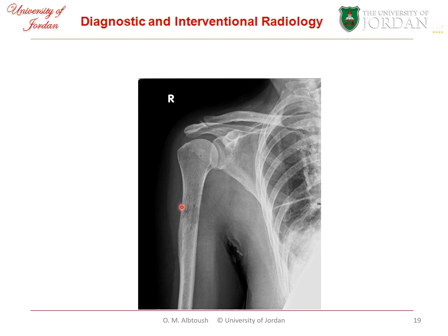Another example, so we have a non-displaced fracture, most apparent at the cortical defect at the lateral aspect, or the lateral cortex, of the right humeral shaft. But please don't forget to say clearly that we have here an osteolytic process and permeative changes at the proximal shaft.